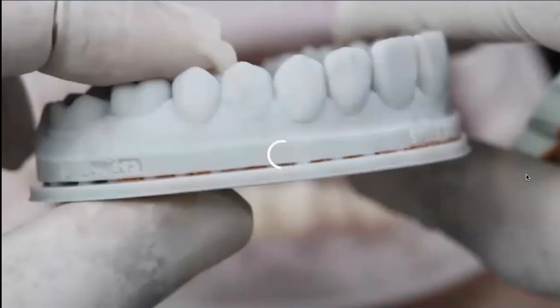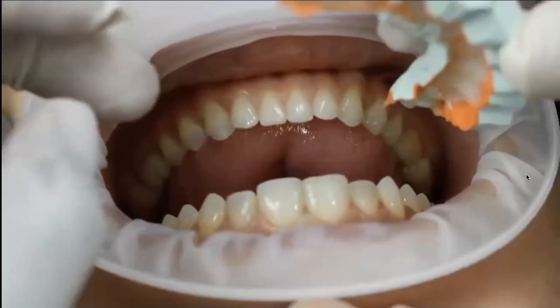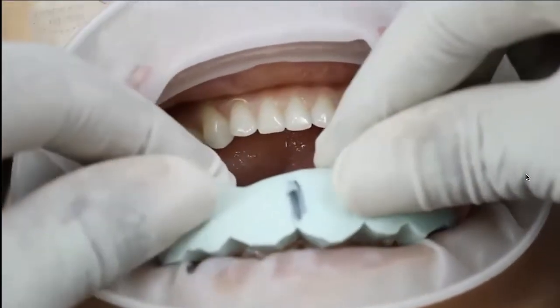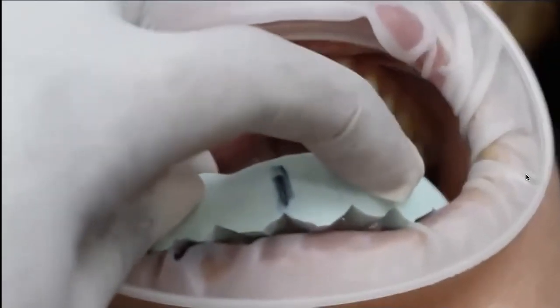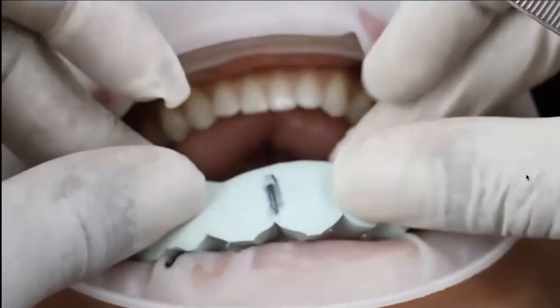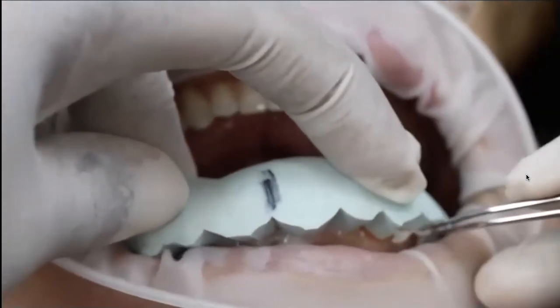So here, for example, what you see, it's a printed model that I designed from SmileFy, which is from the patient that you were seeing here. Notice that the natural morphology of it was already transferred onto the model and transferred onto the silicone key. So with a bisacryl, in that case, I used a Luxatemp bleached shade because my patient wanted wider teeth. So I wanted to give her the best option as possible.